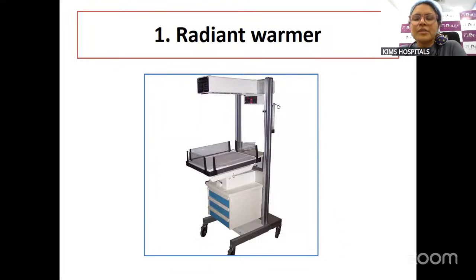So we'll begin with some common equipment that we often see in neonatal ICUs. This is not only a question-rich area, but in terms of clinical application also, this is something that as residents, as pediatricians, we all should know. And we shouldn't be completely reliant on the biomedical engineers or the technicians for managing our equipment, because basic troubleshooting is something that all neonatologists and intensivists need to know. Each equipment will be followed by a few questions, and we'll discuss the answers.